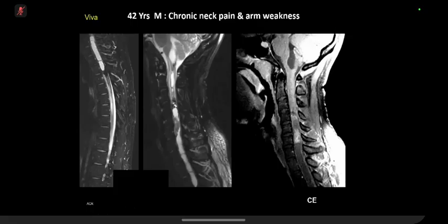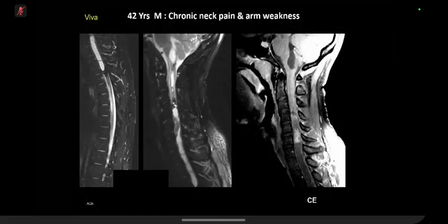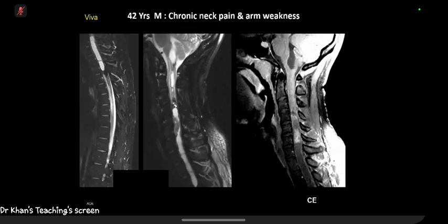Okay, selected sagittal images of the cervical and thoracic spine. So I can see an abnormality in the cord where there is expansion of the cord with an intramedullary lesion. It's causing abnormal cord signal, and on the T1 weighted imaging, I can see some high foci within.